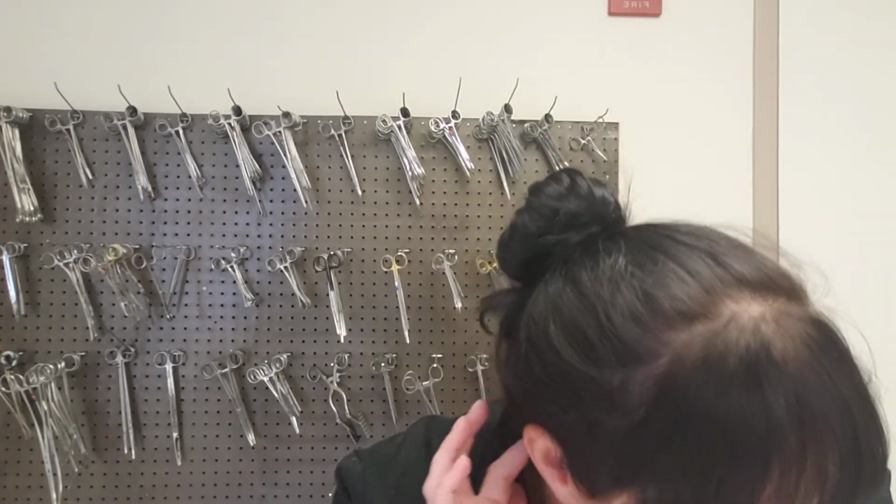Just kidding. But anyways, these bougie dilators are very long and very flexible, and they go down the esophagus, and you can slowly dilate. They're not considered sterile. They don't need to be sterile. They're a semi-critical item because they're going through a naturally occurring orifice, instead of an incision in the body. All right, so that's enough, I guess, on dilators.